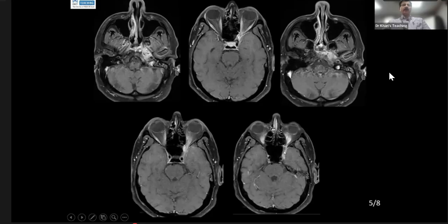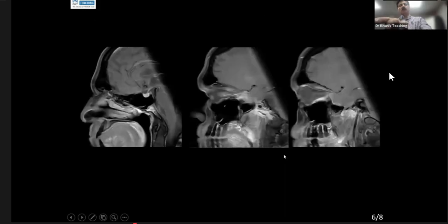When there is cavernous sinus thrombosis, because there is infection there, that infection will penetrate the wall of the carotid artery, and then the patient will present with stroke, complete occlusion of the carotid. So look for that also. That should be your pertinent negative: I can see the normal signal void of the internal carotid, but I can see this enhancement. There is cavernous sinus thrombosis.